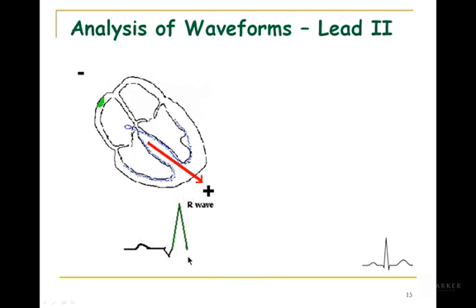even though I don't have it, the S wave, if I follow with the S wave, it's downwards deflected. That represents the current that's flowing up here at the muscle fibers at the base of the heart. And the vector would be running towards the negative recording electrode. That's why it's downwards deflected. And there's not a lot of muscle involved, so that's why it's a pretty small waveform. If you don't see an S wave, you're not dying. It's probably the current flow is running perpendicular to the particular lead axis. Okay, so don't be concerned about it.